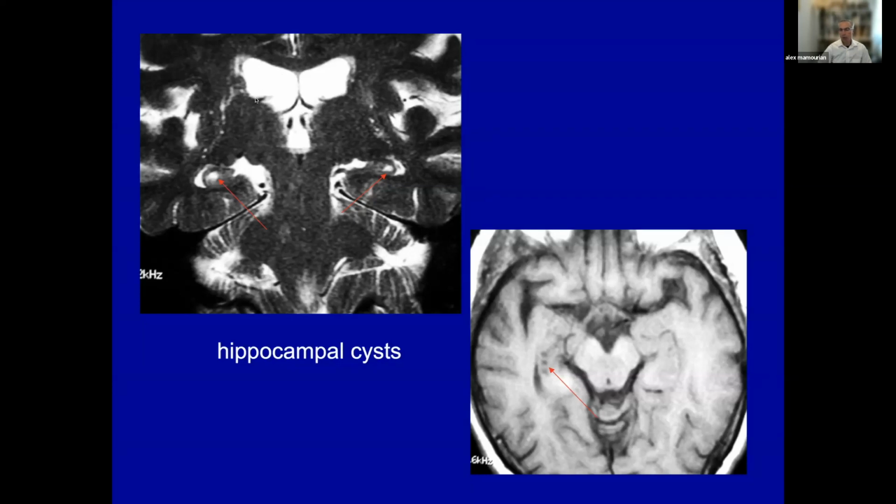As you know, ventricular asymmetry is very, very common. And so the fornix can look stretched on the side of the larger ventricle. So this is not an effective localizing finding in patients with asymmetric ventricles. So again, this is another pitfall. Don't get caught up with this, assuming that this is an indication of a localizing finding for epilepsy.